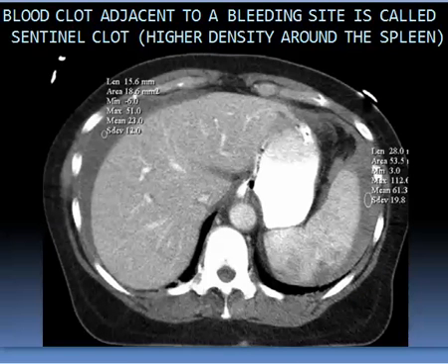In this slide, we can see that the density of the fluid here is more than that of the density there, and that there is laceration of the spleen more than 3 centimeter, with fluid pouring blood into the peritoneum.